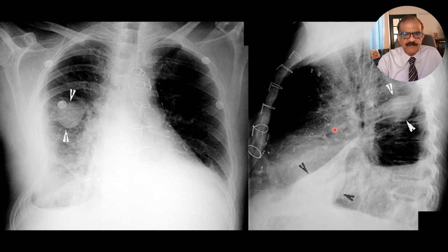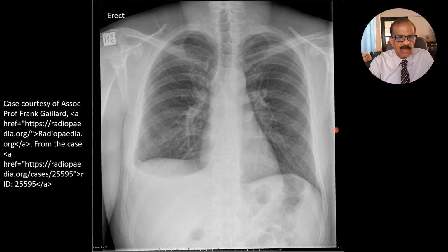Let's move further. What about this one? Do you see any problem here? Actually, this is a module on just X-ray and the pleural effusion, right? So just focus on that. What about this one? Is this side clear?